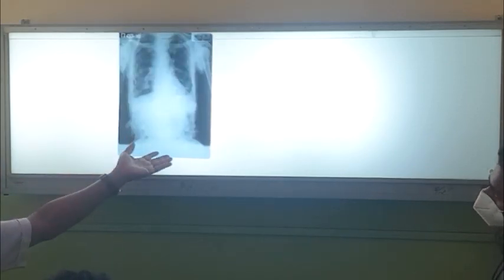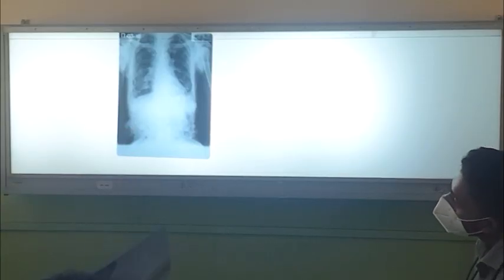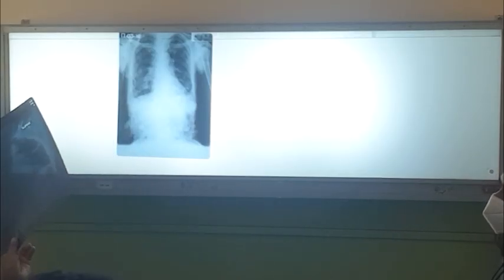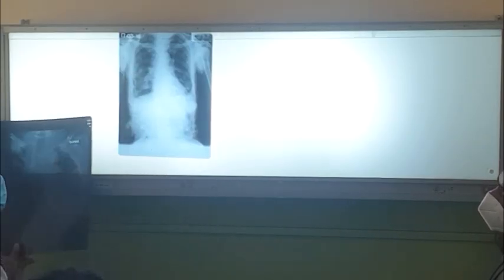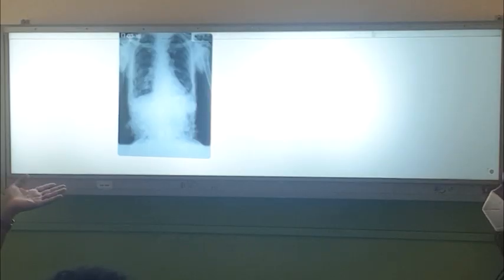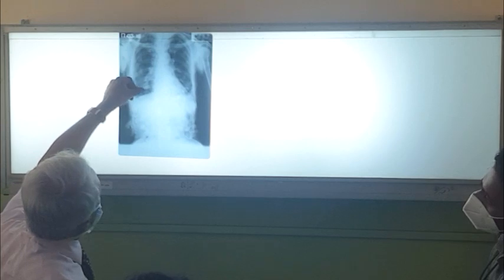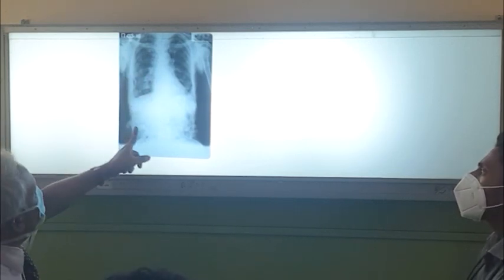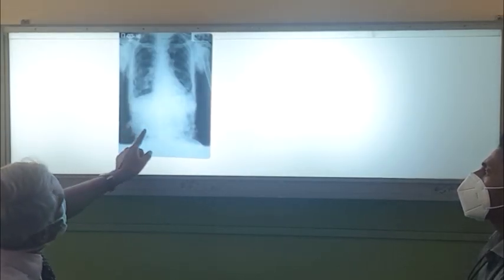These are spot cases for you, right? Sometimes you might get this. What is the diagnosis there? That is why I am keeping these X-rays. What is the diagnosis? Oh, because you see rounded lesions there, here also. Neurofibromatosis, right? A neurofibromatosis patient can present with lung fibrosis. So there is pleural thickening, basal opacity suggesting lung fibrosis. Poor quality X-ray anyway, and a thin patient, right? Everywhere you can see these pedunculated lesions.